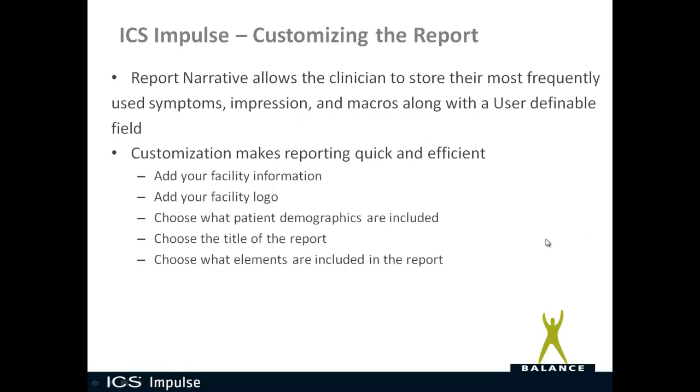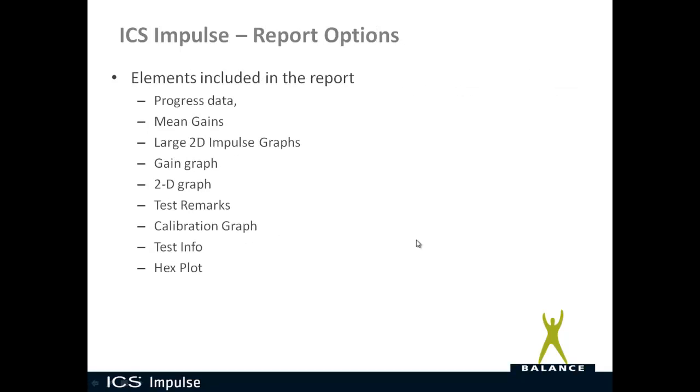So regarding customizing, the report narrative allows the clinician to store their most frequently used symptoms, impressions, and macros along with user-definable fields. And the other things you can do to customize your report, making reporting quick and efficient, is you can add your facility information, add your facility logo, choose what patient demographics are included, choose the title of the report, and choose what elements you want to include in the report. And we're going to talk about all these things today. And we will go through each one of these elements.